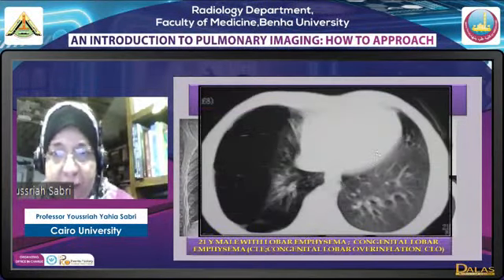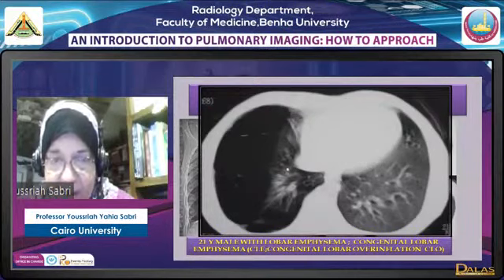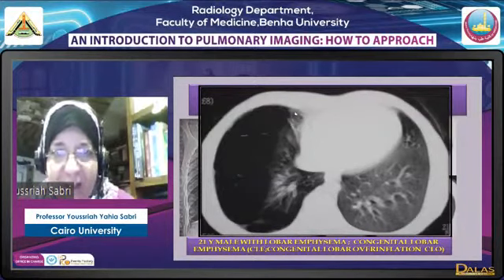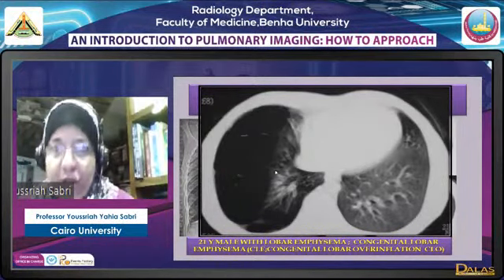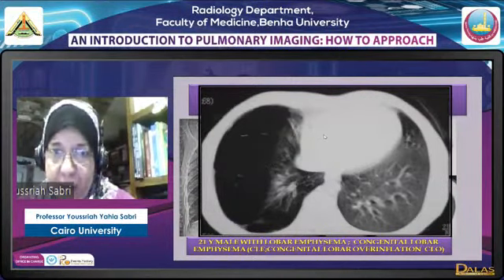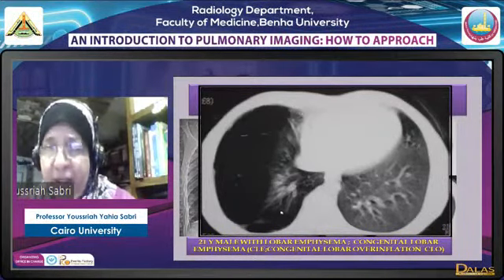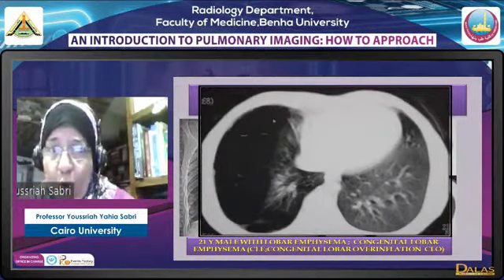If we go to the next images, we find that there is still lung tissue here. So this is hyperlucent, this is not pneumothorax, we have lung here, tissue parenchyma and vessels, sparse but present, and we have this lung opacity. The lung opacity is demarcated by a line. A demarcation of a line means this is a fissure. The lung beside the heart is a middle lobe. The lung beside the spine is a lower lobe. They are both delimited by fissure, so we mean we have a middle lobe and lower lobe collapse. This means that all what we see here is a hyperinflated upper lobe.